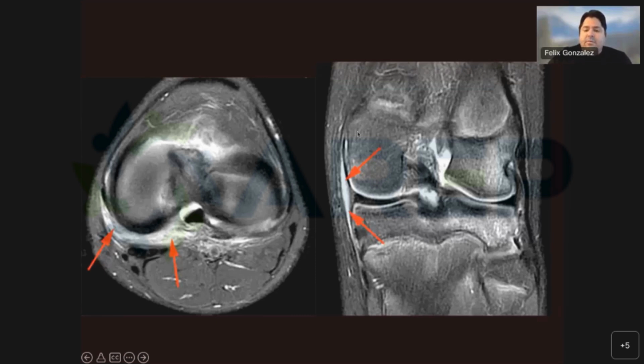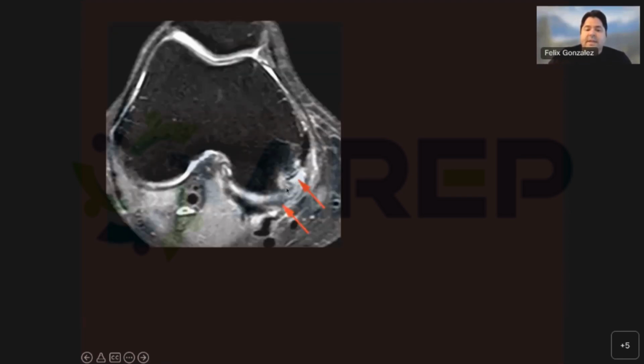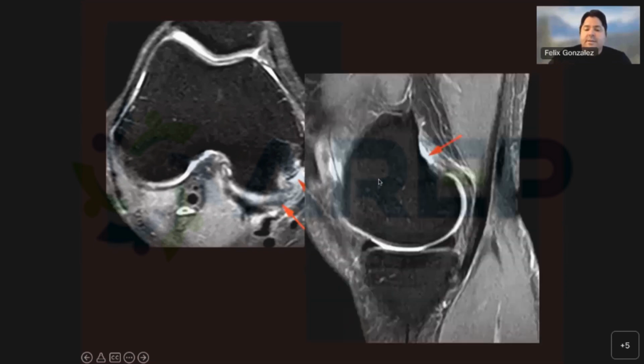And then on that coronal plane, you see how there's MCL bursitis, right? A fluid between the deep and superficial layers of the MCL more anteriorly. Here's another case of that contusion, violation of the capsular ligaments posterior medially. And here, right, we always look back here at the posterior superior attachment of the medial.